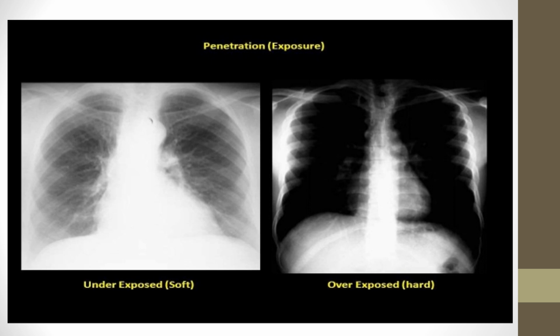On the picture on the left, you can't even see the vertebral body, so that means everything's going to look more radiopaque. It's going to look more dense. It's going to look more closed down. And then on the right, you see it's overexposed, right?